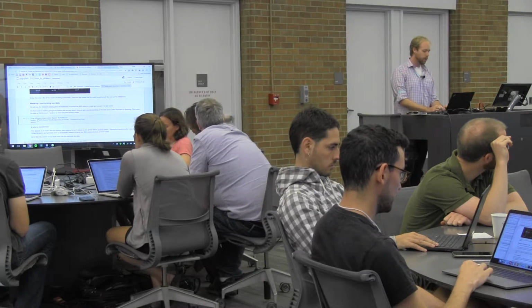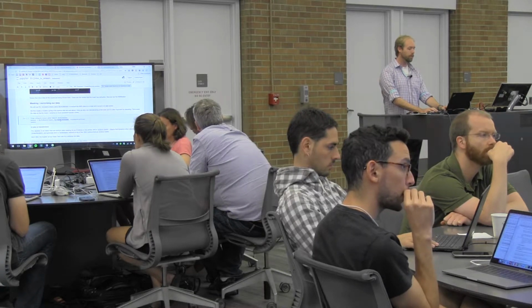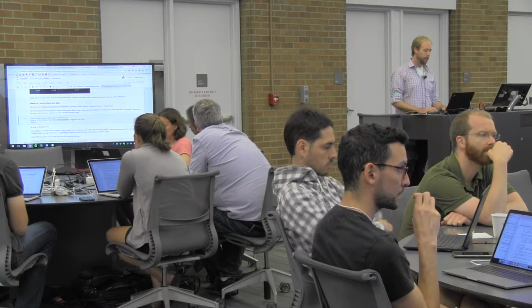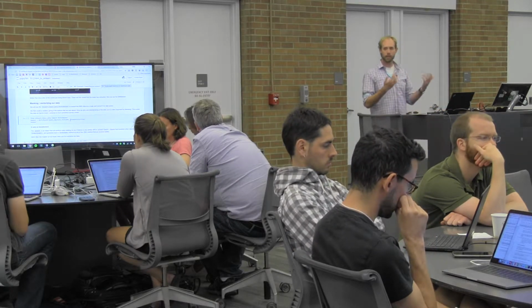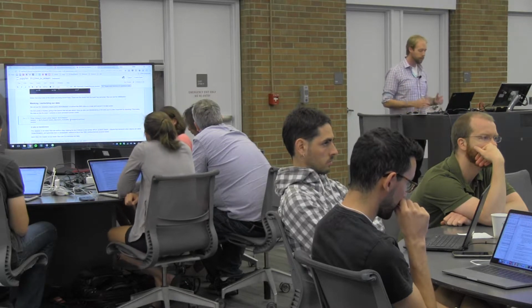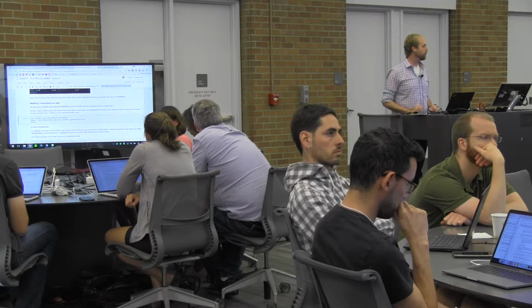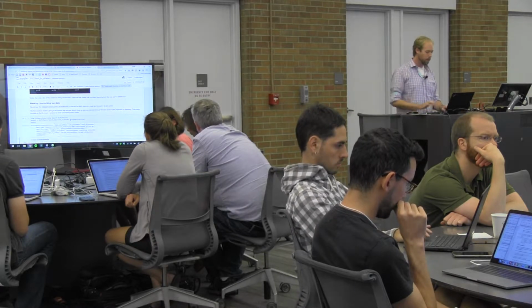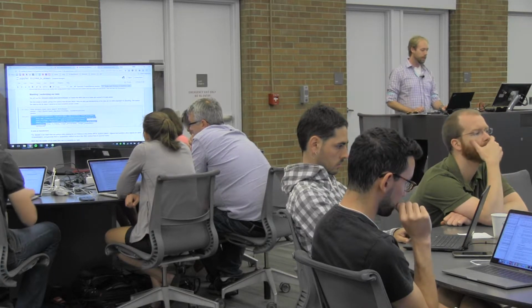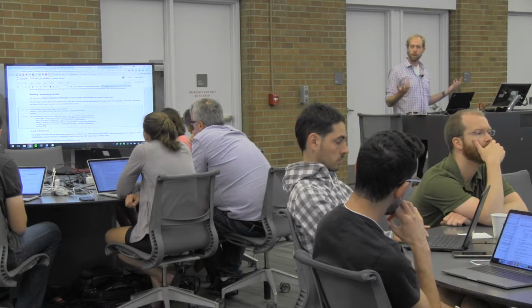So here we're going to create a Nifty Masker object. We're going to give it the file name for the mask image that I just plotted above. And then there are a few other parameters that let you do things like standardize the voxel activity across time, stuff like that. And these are things that you may or may not want to do depending on what kind of machine learning technique you're hoping to apply. So when I run this code, what I get back is a masker object that says, this is an object that I can use in order to mask different kinds of things, as long as they have the same shape as the mask itself.